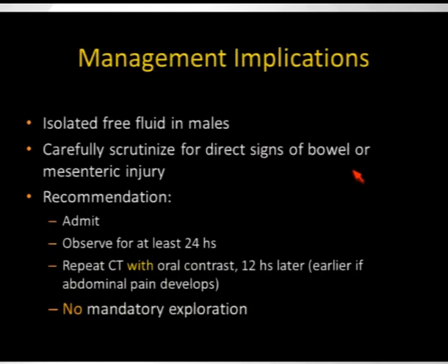So what do we do now with these male patients in whom we see only free fluid in the pelvis? Obviously, we carefully scrutinize the images for potential signs of bowel trauma. And if we don't see anything, then the recommendation is to admit, observe the patient for at least 24 hours if necessary. And that is a practice that has been changing even during the last 1 or 2 years. We would repeat a CT with oral contrast at that point, water soluble, obviously, no later than 12 hours after the initial CT. But no longer do we recommend laparoscopy or laparotomy.